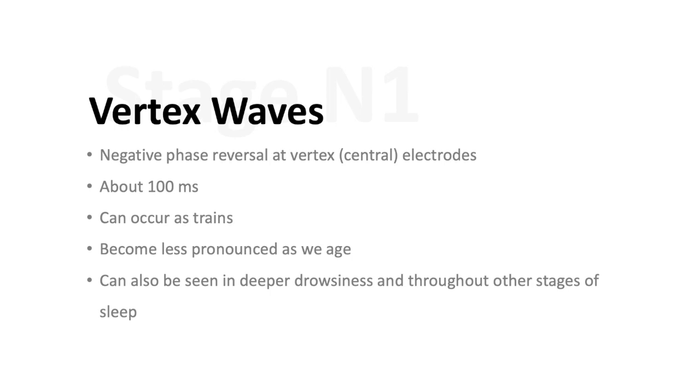Again, I'll mention that technically you can grade N1 sleep by just seeing the aforementioned features of drowsiness according to guidelines, but most EEGers tend to grade N1 sleep when they see vertex waves or POSTs. This is something to keep in mind as you go forward.